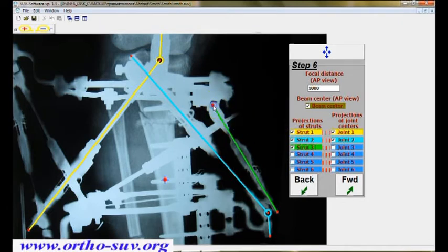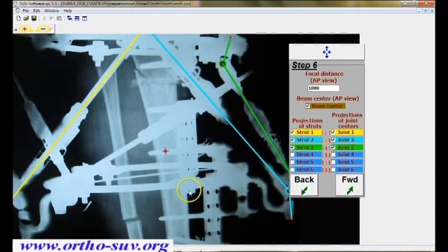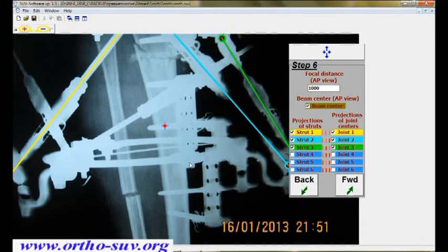Strut number 3, as I told you, we draw from up till down and we align with the center of the strut, and we also see the joint of strut number 3 very well. And now we will mark also the joint of strut number 3 and align the small shoulder of this tool with the axis of the bolt fixing the strut.